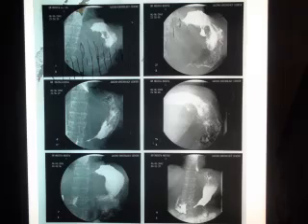You can find here some questions that can be associated with this X-ray film. What is the clinical picture of this patient? Also, what are the other investigations that can be performed for this patient? And you have to mention endoscopy and biopsy as well. Also, what is the best treatment for this patient? For sure, if it's linitis plastica, it should be total gastrectomy.